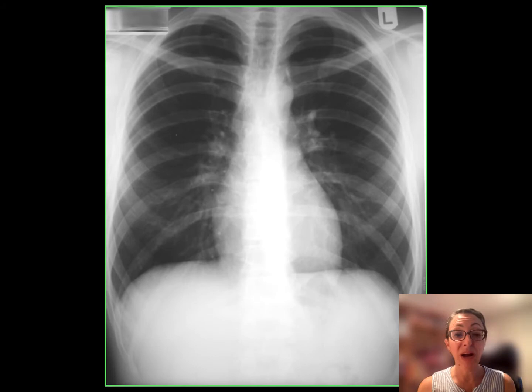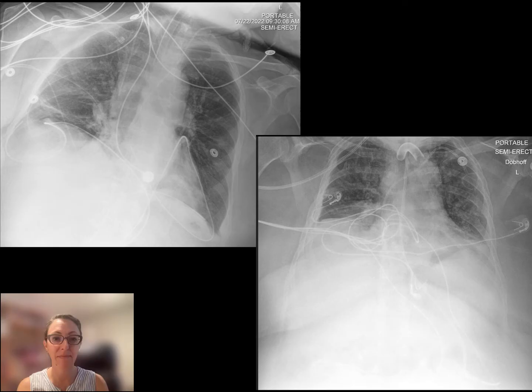In real life, you will have many opportunities to review lots of x-rays, and we hope that they will all be stone cold normal. Unfortunately, many of our films are not exactly normal, containing lots of tubes and lines, external wiring, and tubing, making the assessment difficult. In order to recognize the abnormals, we need to familiarize ourselves with normal appearance and placement of these tubes and lines, and we'll practice the abnormal placement during our point-of-care ultrasound sessions. So let's spend some time reviewing the normal appearance.